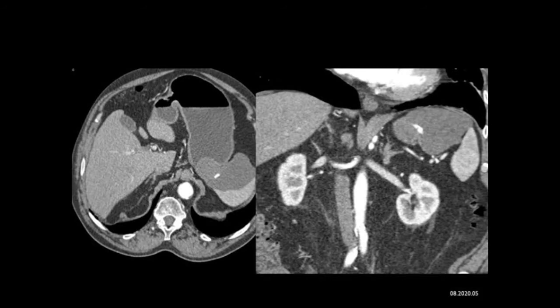So then you think about, what could it be? Well, if it was splenic and primary, you could think of splenic lymphoma. But really, when you look at it, it really is gastric. Now, the thing about it, it's exophytic, and lymphomas can be at times exophytic, but they're more bulky. Adenocarcinoma is typically more infiltrative and not exophytic. This is a classic appearance of a GIST tumor.